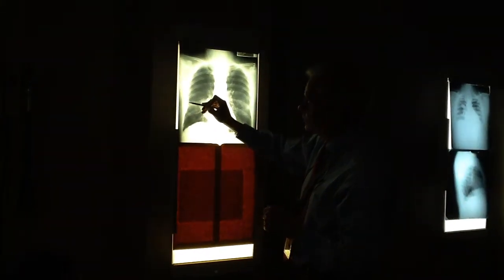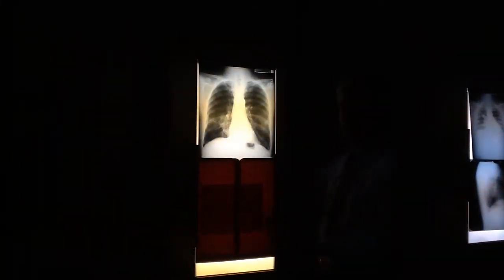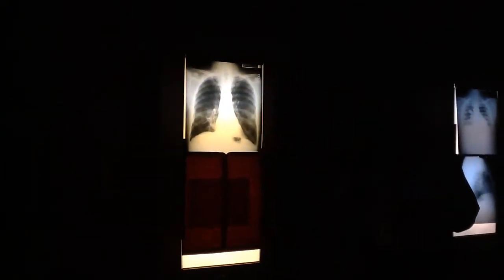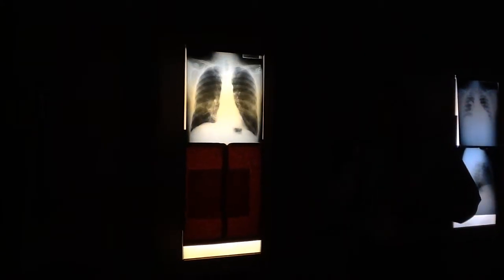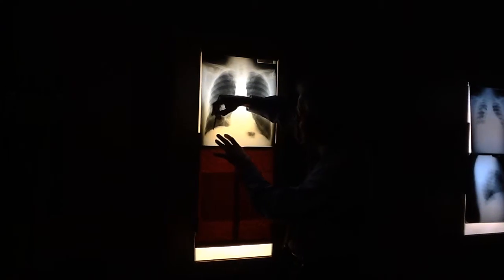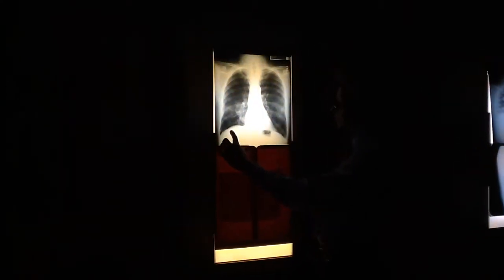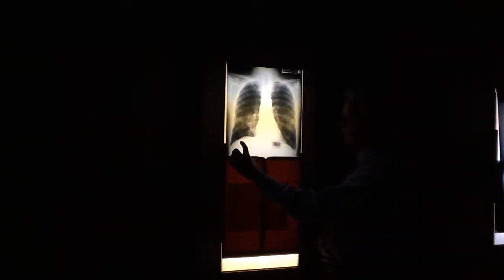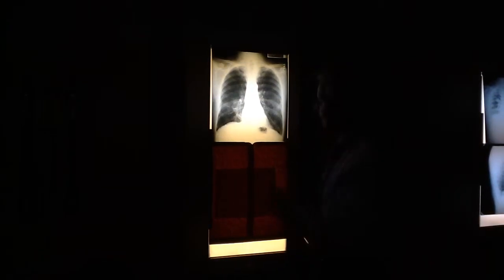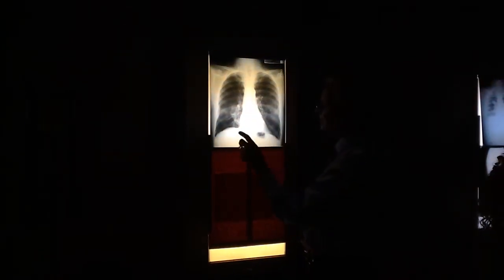This is visceral or parietal. We don't know which one, but it's thickening of the pleura. These are what are called pleural plaques, and that's what asbestos pleural disease does. It also calcifies the pleura. It's very subtle. There's a linear calcification right there. Can you see it? That's just that very faint white line. I can't really tell whether there's any on this side.